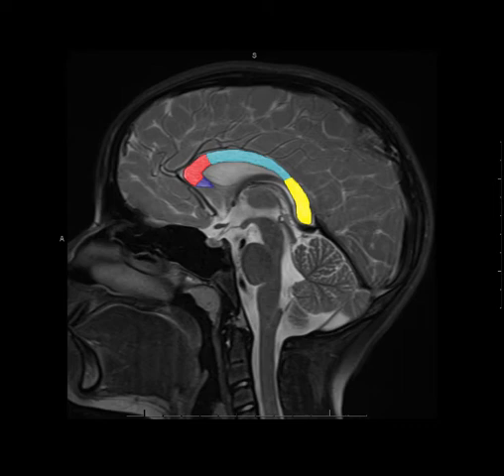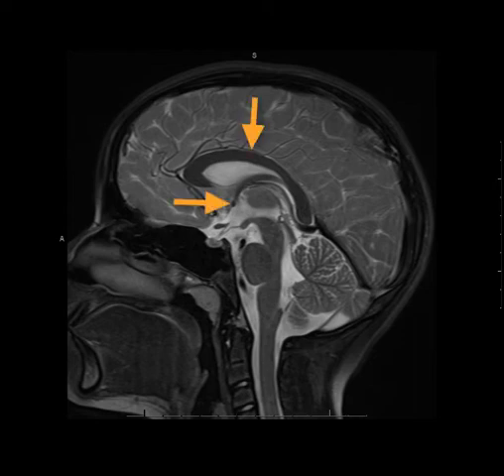The distinction between these different points is made by some anatomical features. There's really no good feature that I know of that distinguishes the pointy rostrum from the genu, but the genu is divided from the body by the line that connects vertically through the mammillary body and the anterior commissure, and it continues through the corpus callosum. And then the demarcation point between the posterior body and the splenium is through the narrow portion, or isthmus, of the corpus callosum, noted here with an arrow. So the three main commissures are the corpus callosum, the anterior commissure, and the posterior commissure, which is here outlined in green.